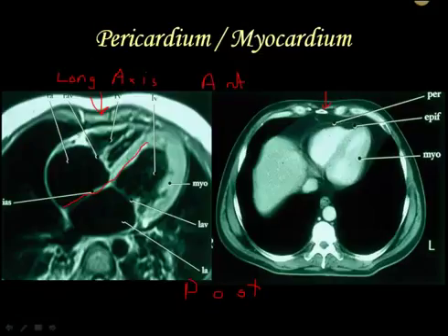Now, with regards to this particular MRI image here, a couple of things I want you to note. First of all, here, notice how very, very thin the myocardium is. This is part of the atria. Specifically, what you're talking about here is the right atrium. This is the interatrial septum, IAS, and then you've got the left atrium. Now remember, the left atrium is actually the posterior chamber, and that's, of course, exactly what you're seeing right here.